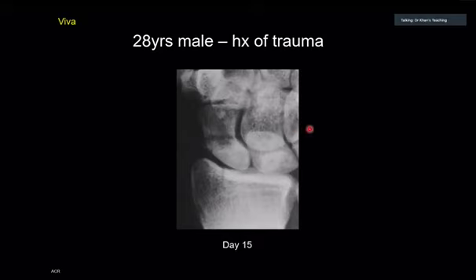How will you tackle this, Phil? This is an X-ray of the wrist focused on the scaphoid. There is a lucent line at the scaphoid waist, and the proximal scaphoid appears sclerotic. So there is AVN of the proximal scaphoid due to a scaphoid waist fracture.